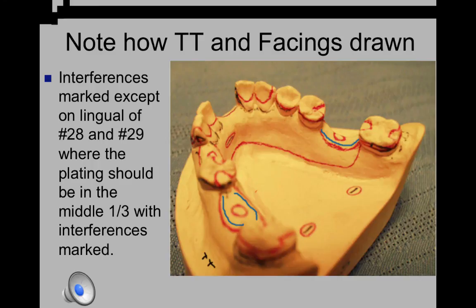The following slides show how various options could have been used. There were several options that were desirable. How you did on the cast may depend on some other factors, such as, 1. The selection of the best clasp design in an area would influence the grade. If it worked, it was going to get at least an average grade. It would not get a minus unless you left one off or totally blew it the way you drew one.